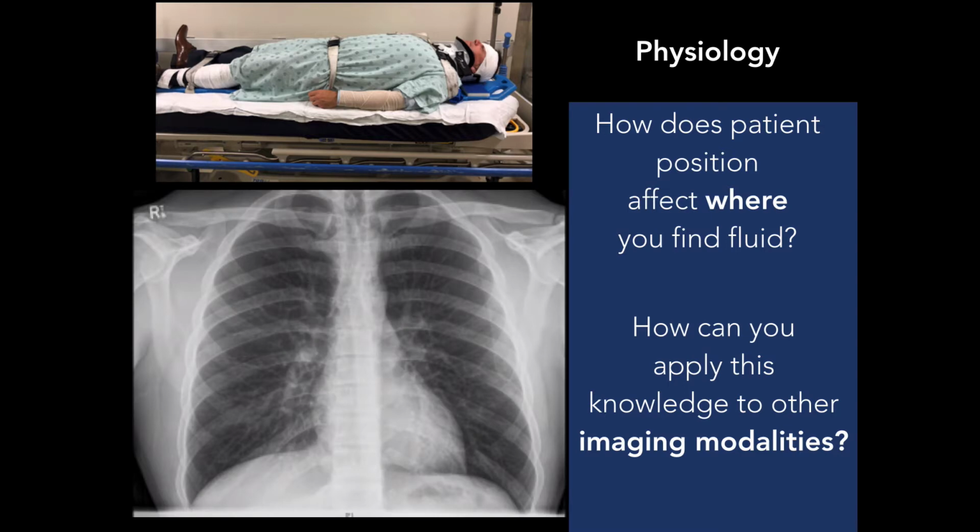So here's the X-ray. Remember on X-ray, black is air. It's opposite than ultrasound, okay? Sometimes it gets a little confusing. Ultrasound and X-rays are backwards from each other. Do you see free fluid in this chest? Do you think there is free fluid? So it may not be any free fluid there, but it could be there. If it's there, why are we not seeing it?